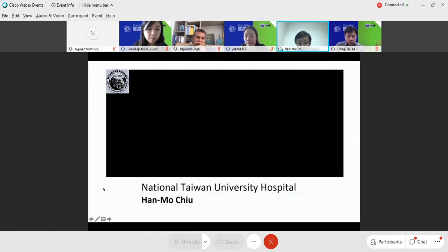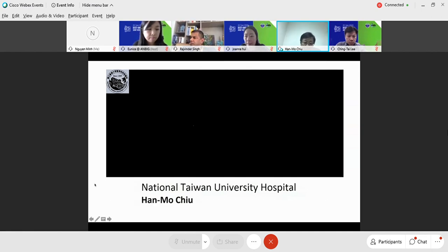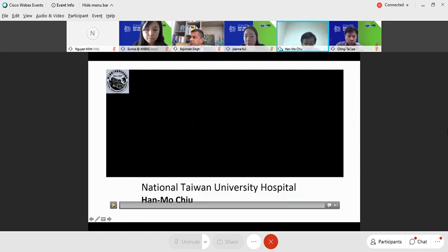So many doctors may ask whether chromoscopy is still necessary with NBI. So I show this example before finishing my talk.